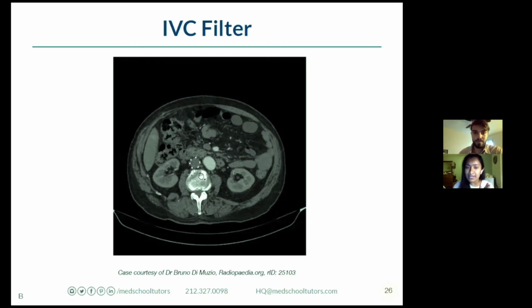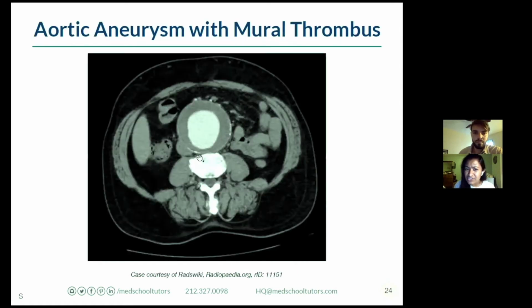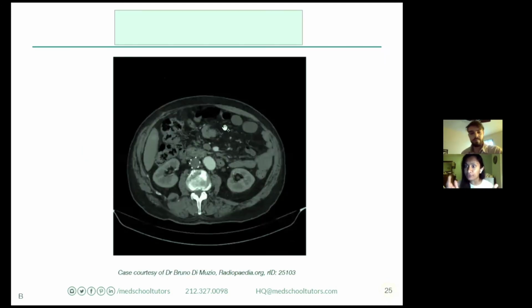What I'll start by saying is, we know we have 2 vessels. We know the aorta is always on the left, barring some anatomic variant. But what I'll also say is these little spots here are very, very equally spaced out. Calcifications are not like that. I'll go back to the prior case. These calcifications are a little bit here, a little bit here, a little bit here, but it's not very uniform. This is this many centimeters, this many centimeters. We're seeing a very structured thing.